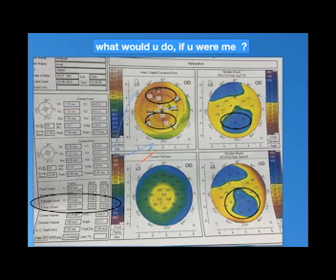Second, the posterior elevation, which coincides with the inferior part of the cornea, is not high. So it's not expressed as a weak cornea or keratoconic topography of the cornea. The same in the posterior elevation and anterior elevation. There is minus, there is no plus. There is no protrusion.